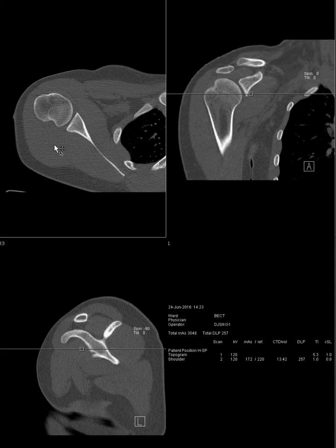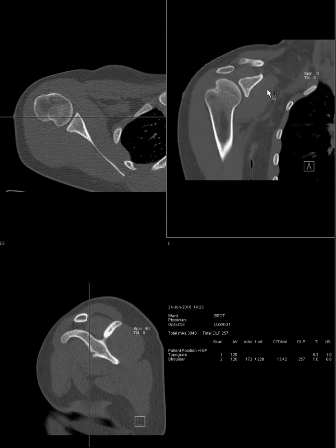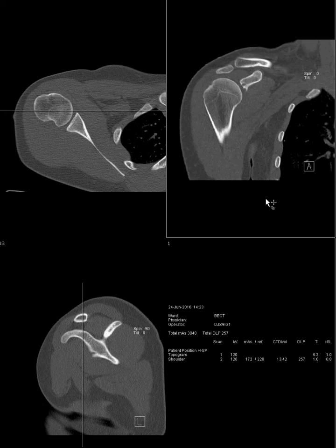Now, based on this, you would want to reconstruct the coronal and sagittal planes, but what you can see here is that this sort of coronal plane, if you look at the line on the axial images as I scroll through the coronal images, they're just coronal relative to the tabletop. They're sort of parallel to the tabletop. But the tabletop is not the reference position we should be using. That might be the case if you're doing abdominal imaging or even brain imaging perhaps. But the joints are obliquely oriented, and you have to adjust your imaging planes appropriately.